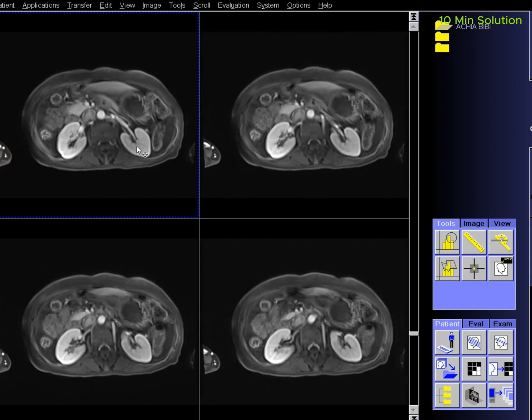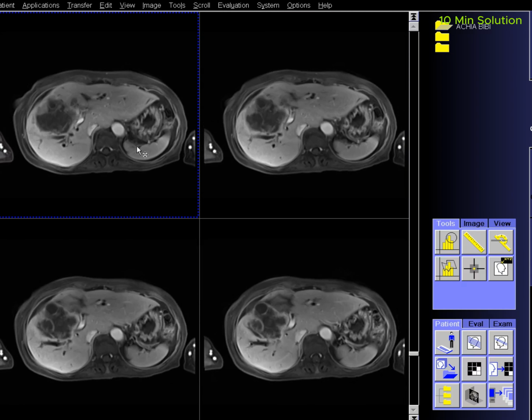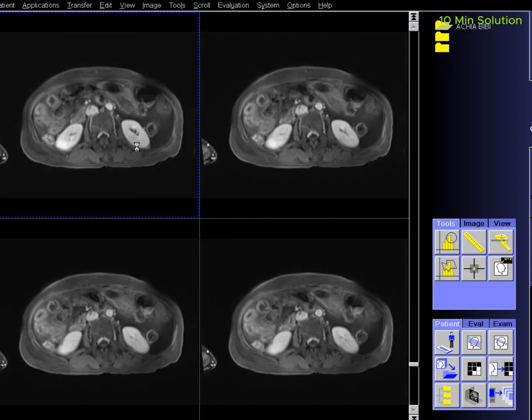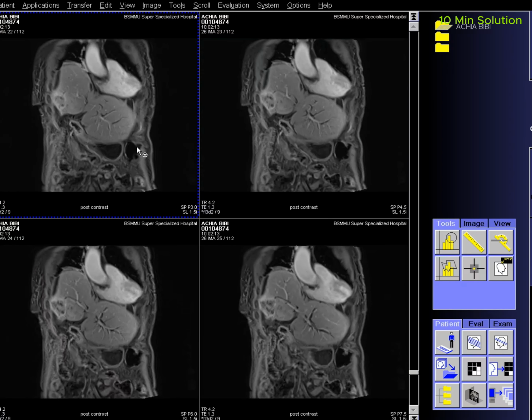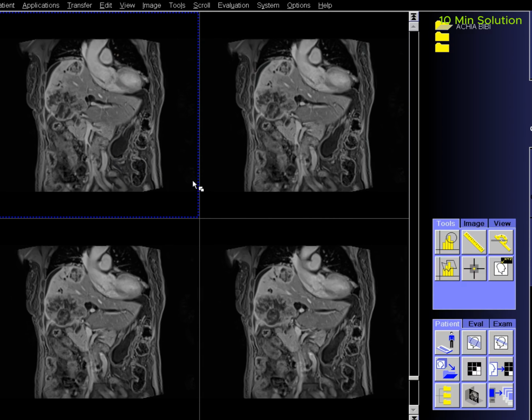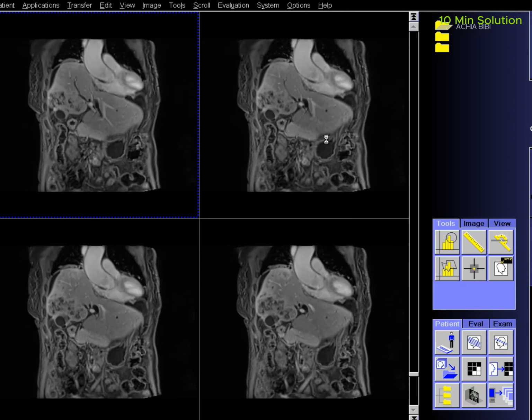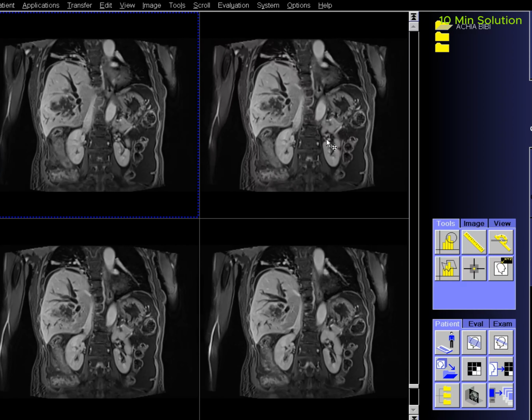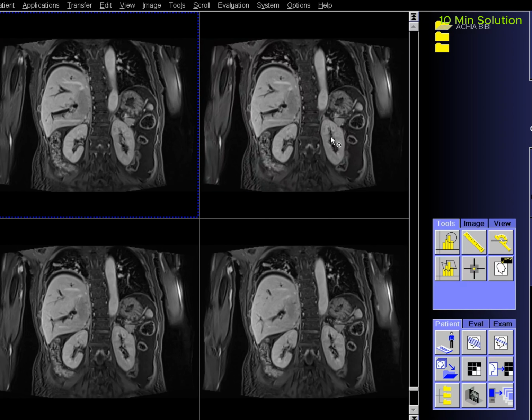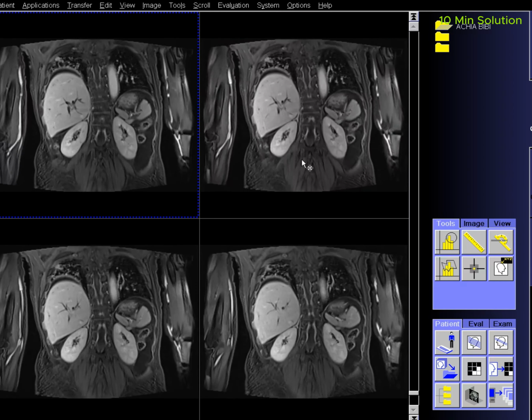Care bolus technique. The care bolus technique is the most commonly used method for bolus detection. This technique involves employing a coronal fast gradient refocused sequence to obtain real-time images every second through the vascular structure of interest, typically positioned over the heart. By monitoring the arrival of the contrast bolus in the heart, the operator can then switch to the centric 3D dynamic sequence for further imaging.